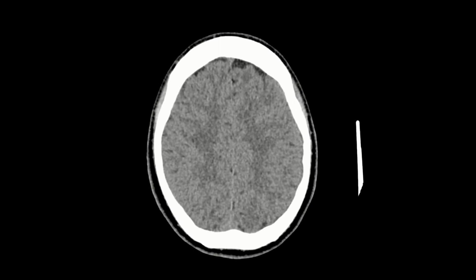Alright, so let's talk cerebrovascular territories. So we have many vessels feeding the brain. The cerebral vessels include the anterior, middle, and posterior cerebral vessels. And in addition, we also have the vertebrobasilar system, which supplies the brainstem and also forms an anastomosis with the carotid system. So we are going to look at cerebrovascular territories at three levels. One is above the lateral ventricles. One is at the level of the insula. And the last would be at the level of the cerebellum.